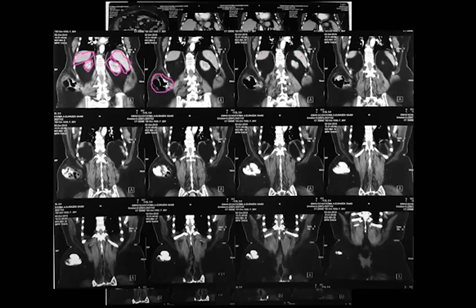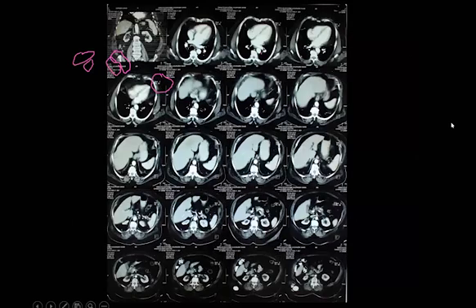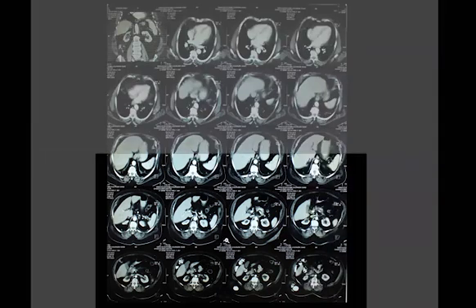Let's see. ممكن من فضلك يا عائشة تحط لنا the axial cuts مرة تانية. Let's see the axial cuts. Can we identify on the axial cuts? يلا ايه رأيك؟ Is it identified on the axial cuts? See, in this situation, you need to look at all the cuts because one cut will not be sufficient. يلا screen them quickly. You're looking at one location. You're looking at the right or the left. Left, افتكري. The right or the left.